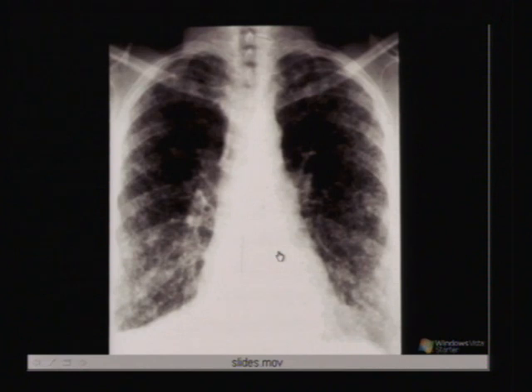This is an atypical sarcoid where you don't find any lymph nodes, and you see a diffuse disease which is involving mainly the basal areas. So as we have already described, in sarcoidosis the parenchymal involvement is mainly in the upper lobe. In such circumstances, histopathology plays an important role in the diagnosis of the disease.